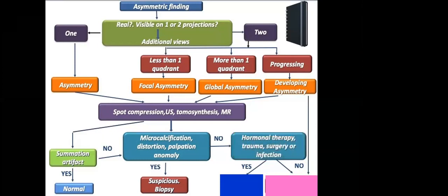If there is a history of this, then I'll consider it probably benign and follow it up. If there is no history, I will consider it suspicious.